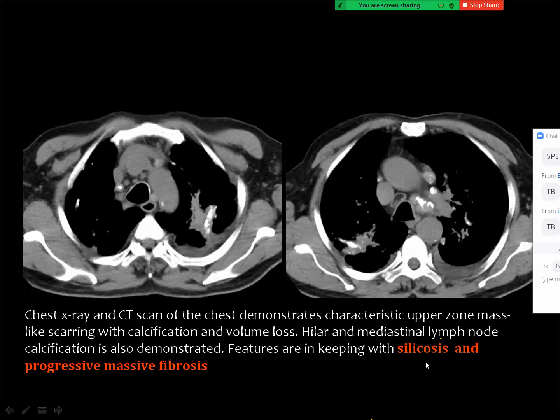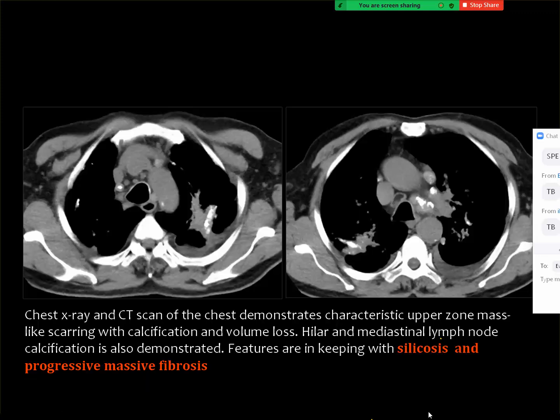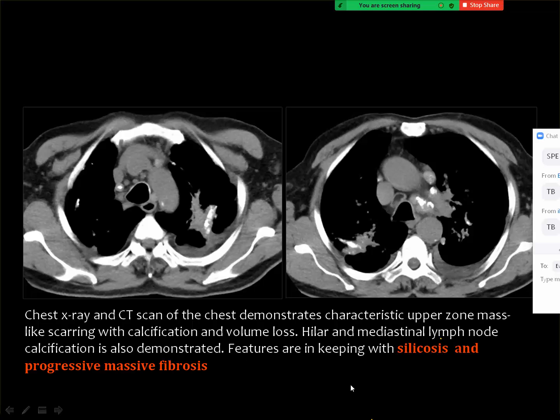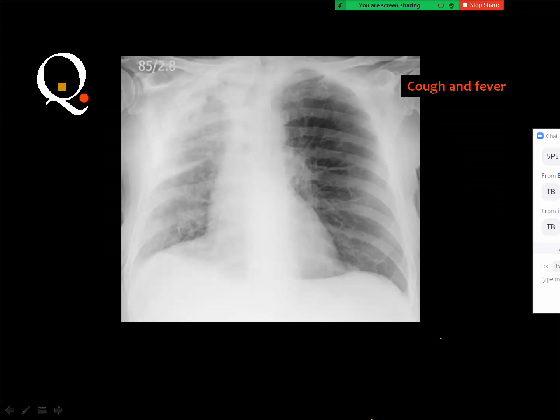Then this is of course the progressive massive fibrosis of pneumoconiosis. You got two big masses on either side of the upper part of the mediastinum, and you may see some of the pulmonary nodules scattered everywhere, and this is, of course, not that evident in the plain film. And if you say from the plain film only that this is TB, you are right. Then after the CT, you should change your opinion to the progressive massive fibrosis.